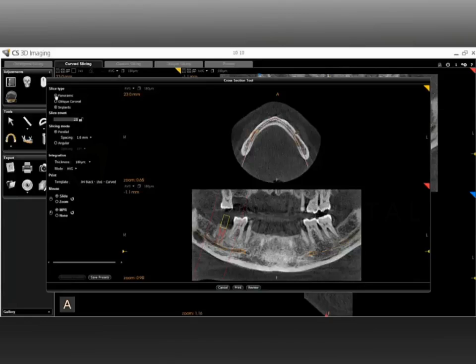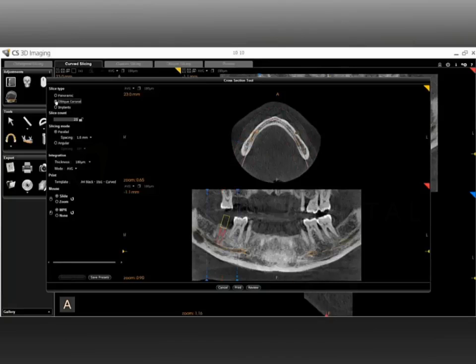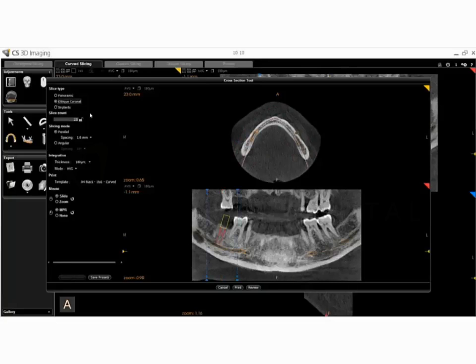First, select the slice type. The region of interest views change to reflect your slice type. Next, click and drag the colored dotted lines in the region of interest views to set your region boundaries. Next, set the slice count. The default slice count is set by your defined region of interest, but you may modify it here.